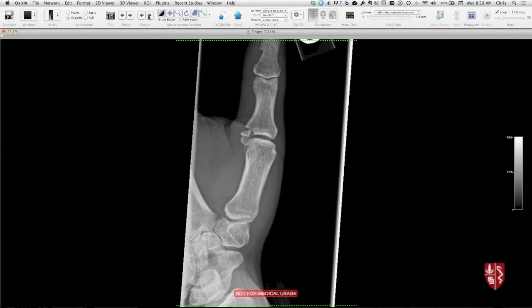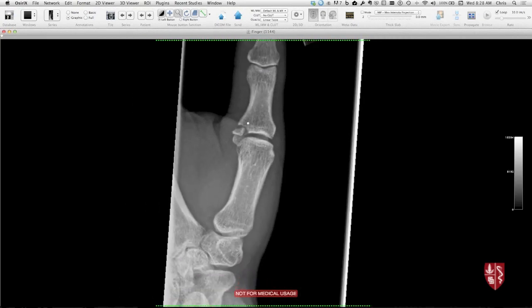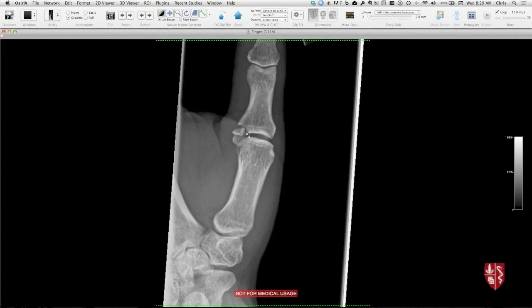This one, somebody mentioned this entity a minute ago. So this little fracture right there, I think it was Lewis. What did you, well, you didn't call it, yeah, it wasn't this case, but yeah, so this is fracture of the proximal phalanx base on the ulnar side here. And got to be careful because there normally are sesamoids that sit there as well. So this may be a sesamoid here. But this is an abnormal fragment.